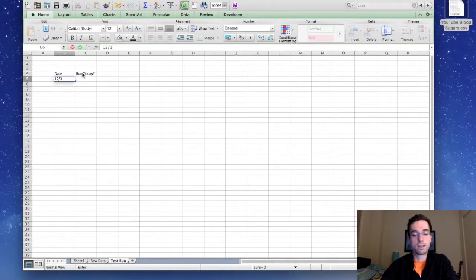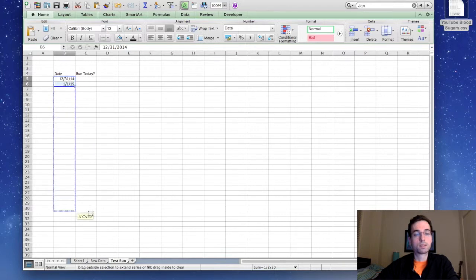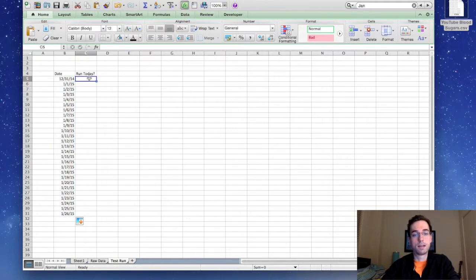So I think my earliest date was 12/31/2014, and then I have 1/1/2015. And once you create a couple, you can just drag it down. And mine goes until 1/26. And you input your data here. So I'm just going to make it up for now.